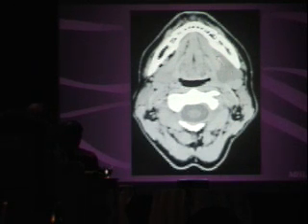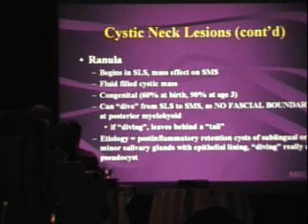Here you see one that seems to be starting in the submandibular space, then looping around the back of this mylohyoid muscle, around this blind-ended pouch, and breaking forward and coming forward. So it could be in two spaces. But it's unilocular, not multilocular, so you wouldn't confuse this with a cystic hygroma or lymphangioma. Again, we're talking about pediatric tumors here, at best in young adults. There is no fascial boundary around those diving ranulas, so there's nothing to break through there. It might leave a little tail. And again, there arise post-inflammatory retention cysts, usually starting in sublingual space, moving to submandibular, but they could go in either direction.